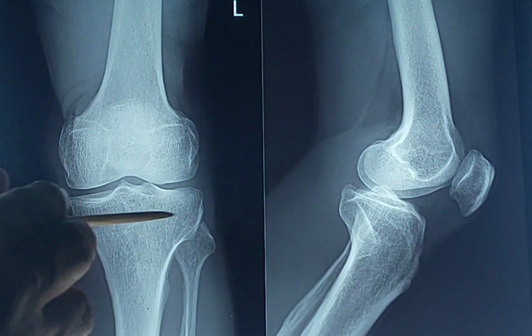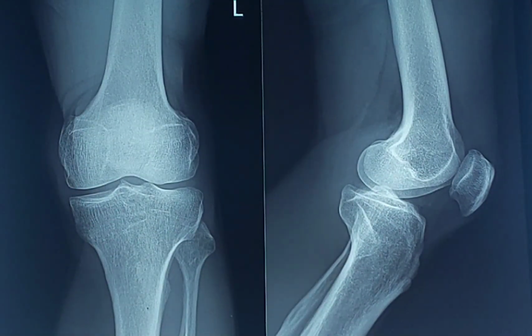Of these two bones, tibia and fibula, which one is massive? It is clear from this film. The tibia is more massive than the fibula. Why? Because the tibia transmits more weight than the fibula, where a negligible weight is transmitted through the fibula. So tibia representing the preaxial bone transmits much of the body weight than the postaxial leg bone fibula, which transmits less weight. So it is thin and it is stout or massive.